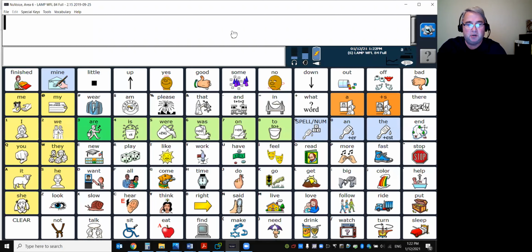So some words, it could be a common word. In the old days, the word taco used to come out wrong. Most of the companies that develop the synthesizers of the voices do a really good job. But you never know when you're going to try to add, storing a new word in there, or going to spell mode, and it doesn't sound right.